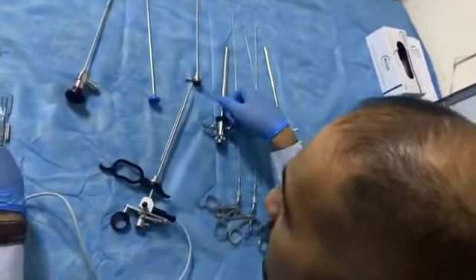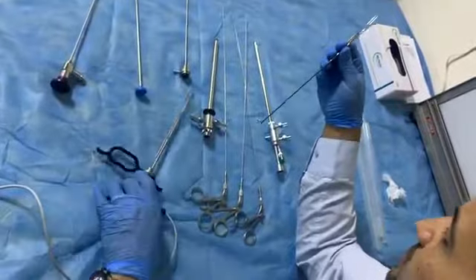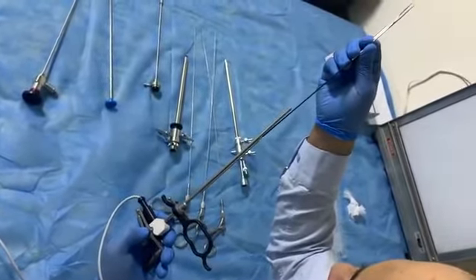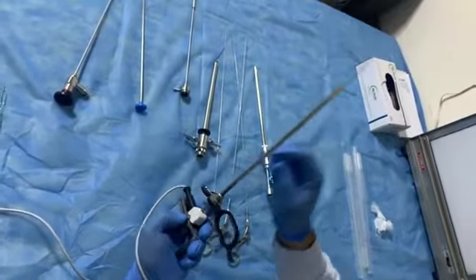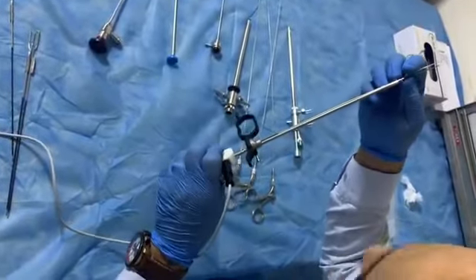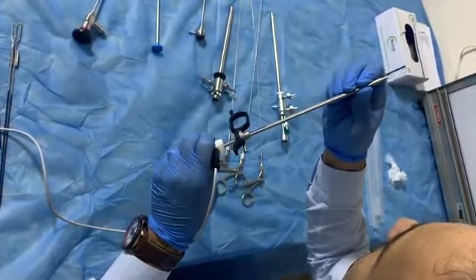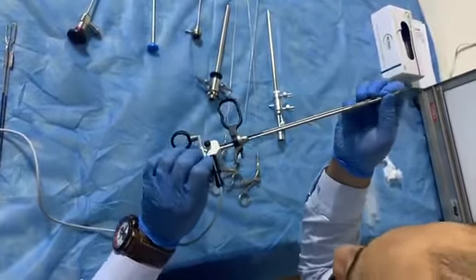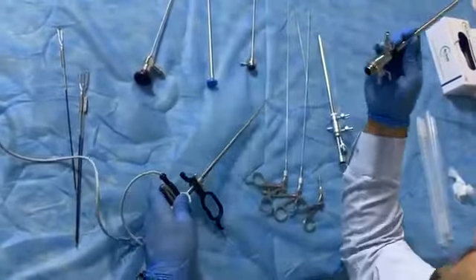So another type of electrode. This is another type of electrode. Don't forget two channels. This first channel, pass it through this orifice and from here, and press on this button. Now it is fixed. It is ready. Now where are the outer and inner sheath? This outer and inner sheath.